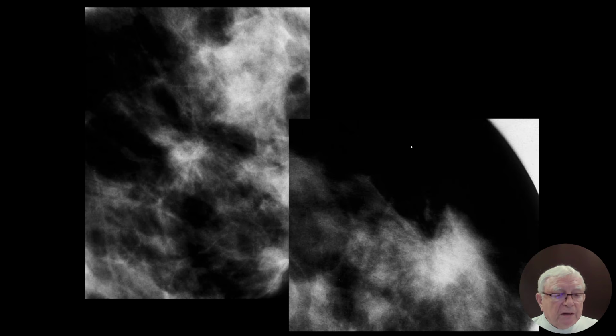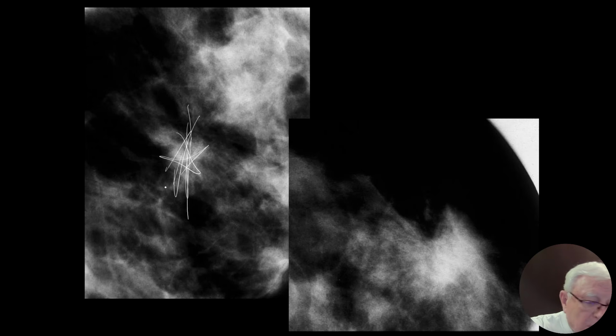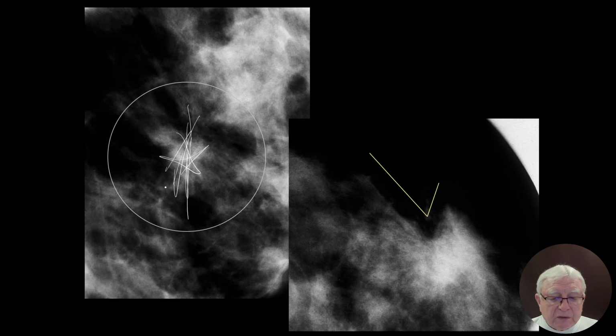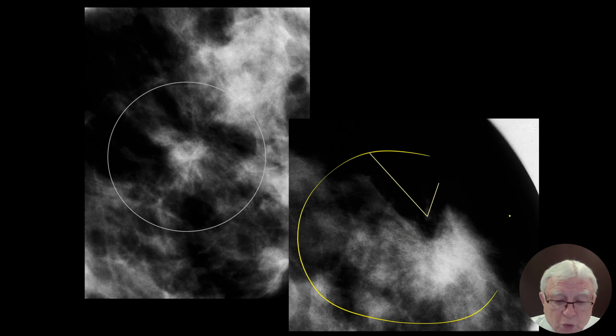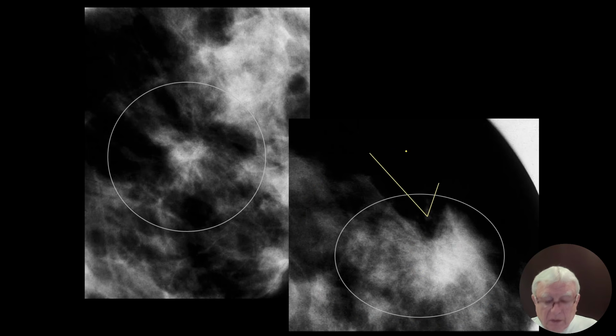Do you see an architectural distortion? Oi, this is very difficult. But here is no problem because we don't like acute angles. Here is a radiating structure. I don't see central tumor mass. And on a better day, I would say this is a black star. For two reasons. Too big for the lack of the central tumor mass.